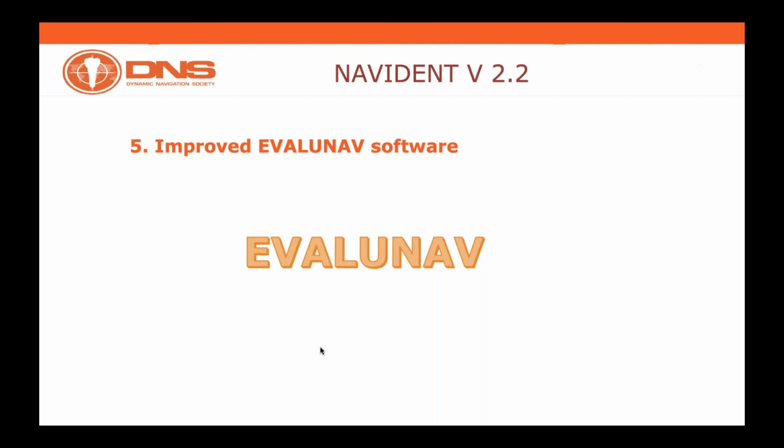So you do have a chance within this environment to import the two data sets, the pre-op and the post-op CBCT. And what Evalunav enables you to do is to really match the post-op with the pre-op and quantify exactly the difference between implant placement and implant planning. This operation has been simplified and has been rendered in a very intuitive operation.